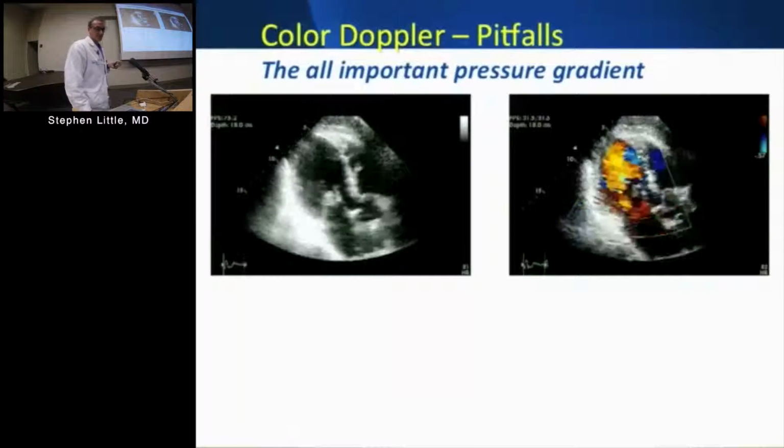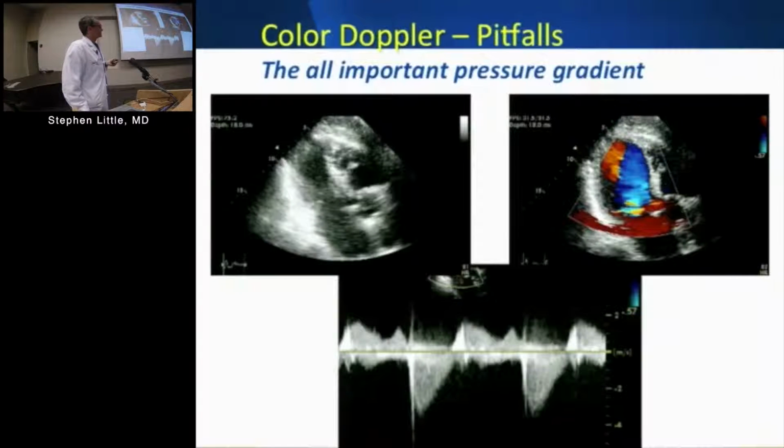Draw blood cultures. You do the continuous wave Doppler. It's a very dense, triangular jet with a very low velocity, less than 4 meters, suggesting very little pressure gradient between the LV and the LA. No pressure gradient, big lump. What that is, is a papillary muscle rupture.